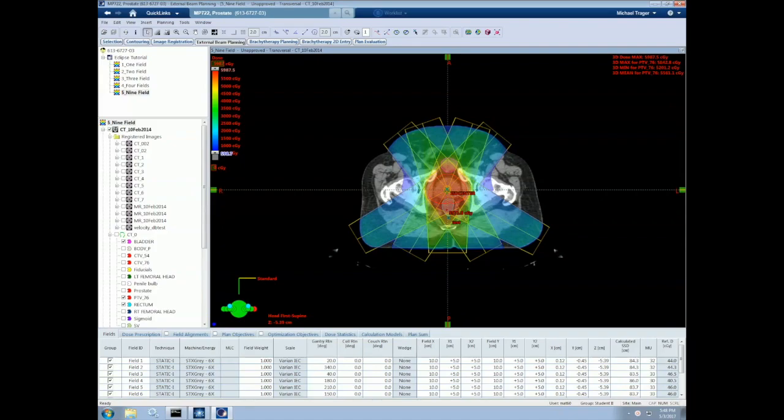Before we get started with making a plan, it's important to discuss some basic strategies for treatment planning. Let's do so by looking at a prostate plan. Rather than using the prostate phantom we used in previous videos, we'll use this anonymized patient with physician-delineated contours. The goal of treatment planning is to deliver a desired prescription dose to the entirety of a tumor, while limiting the dose to healthy tissues to the best of our ability.